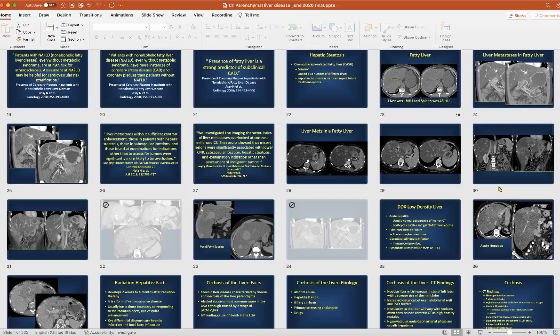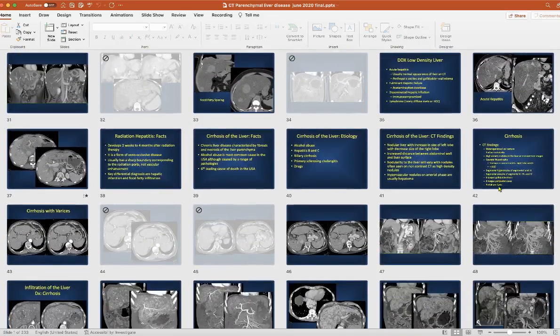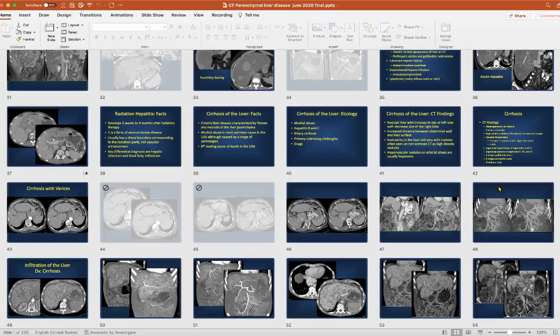When we talk about liver disease and liver infiltration, we also want to make certain that we look very carefully at the vessels. Are the vessels stretched? Usually with fatty infiltration, you'll see the vessels very nicely. When you start seeing vessel distortion, then you really need to worry: could you be dealing with an underlying malignancy? So for example, things like lymphoma can infiltrate the liver. I don't think it's typically a problem. Lymphoma most of the time enlarges the liver, but occasionally it can be infiltrative, and it can be kind of tricky in that regard, particularly if you're not thinking about it.